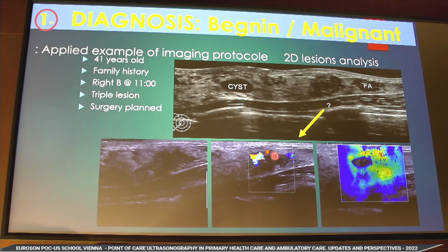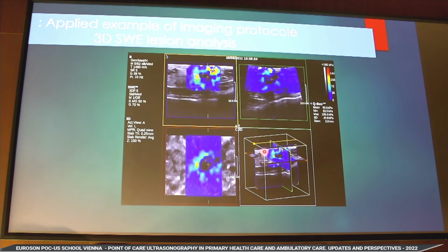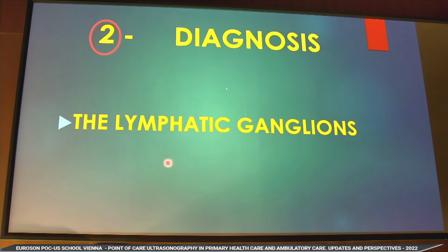So it's a very, very precise analysis. And with the 3D, you can see the orthogonal involvement of the tumor. And you see that the center of the tumor is not really active. In the desmoplastic reaction around the tumor, you have a lot of modification with edema and inflammation.